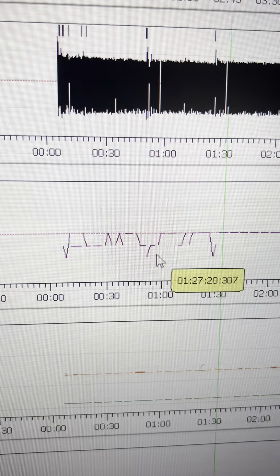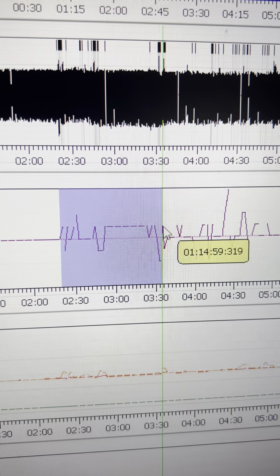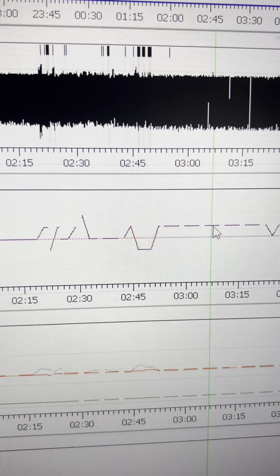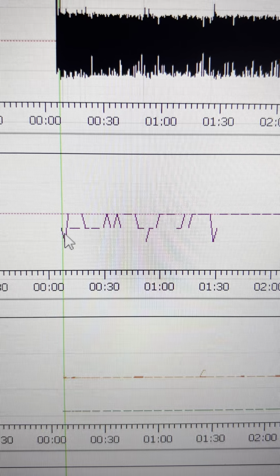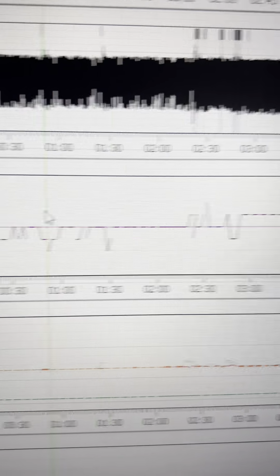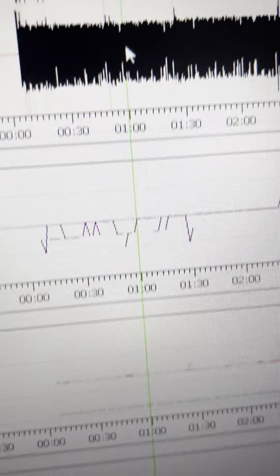And then when it's above the line, like right here, you're gasping more for air. So you're breathing faster, you want to breathe in more because you're not getting enough air. And when you're seeing these ones under, then you're under ventilating, you're not getting enough air. Maybe you're trying enough, so it's similar to this under it, or you're not trying enough. Then it is not like this and it's just under.